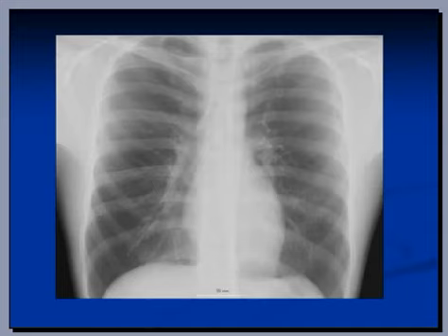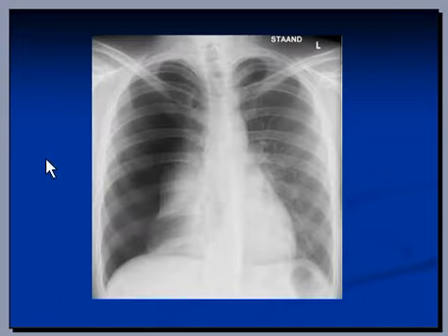Well, in case of pneumothorax, you would not be able to see these vascular markings, as in this X-ray. So this is a normal left lung, and you can see vascular markings going through the lung parenchyma, versus on the right hand side, this is a black area and you cannot see any vessel going through this area, and that's how you diagnose a pneumothorax.